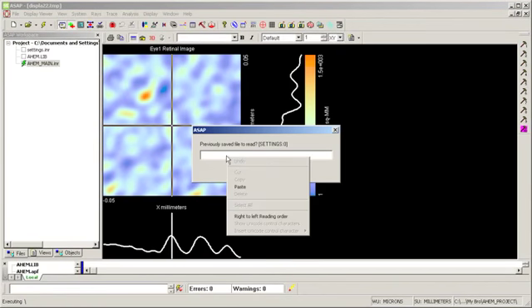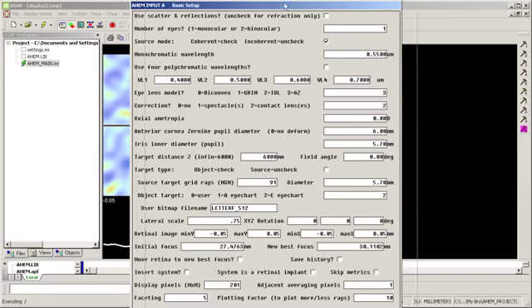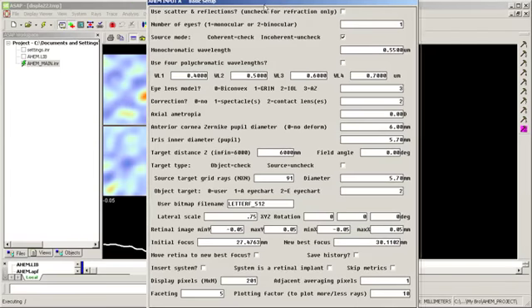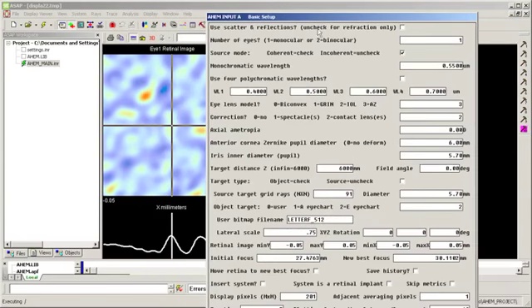I've got a settings file with contact lens. And I go to AHEM and my basic setup. So now when I go to correction, I select 2 for contact lens or lenses if I had 2 eyes. And the rest of my setup is fairly standard. And I'm also using a coherent application here. So I've got a retinal window here, the same size as the retinal window we saw here. And I've done some correction with the toric lens.